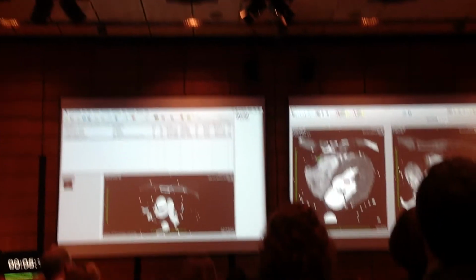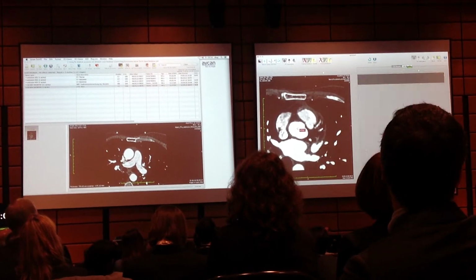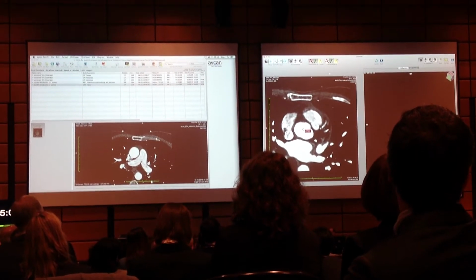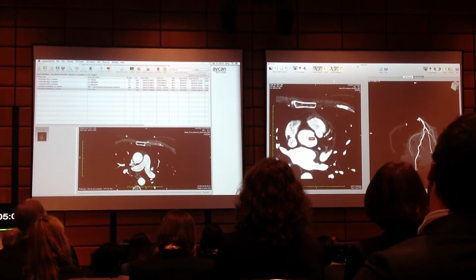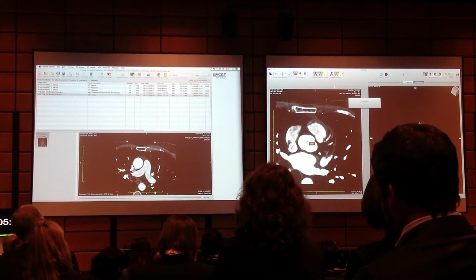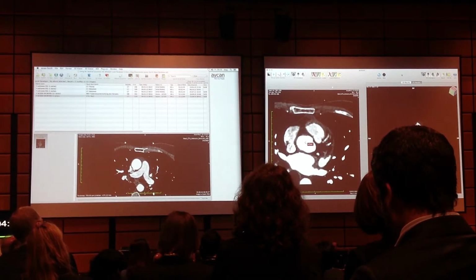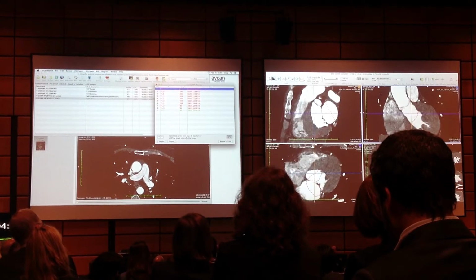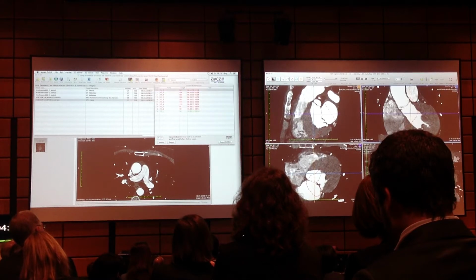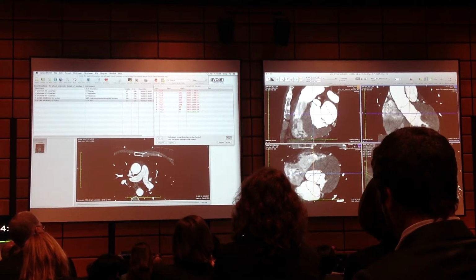By giving it 2 more seed points and updating my segmentation, I also get the segmentation of the RCA. In the next step, I'm going to calculate the lumen center lines for the quantifying of the vessels. And first to see the LCX.